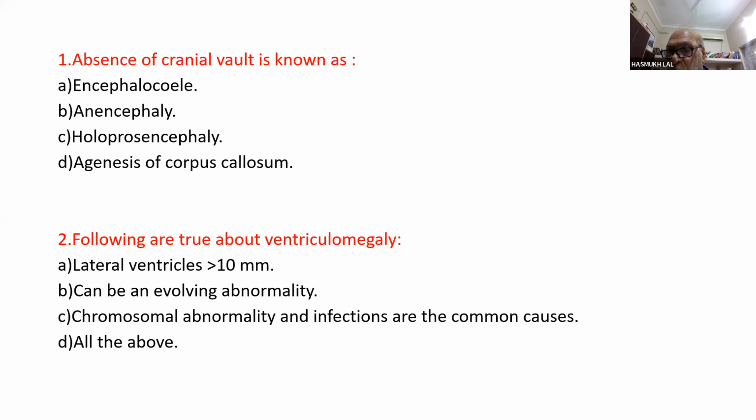the parieto-occipital sulcus and the glomus. So both are actually very, very close. Because the glomus sometimes can be misleading, this parieto-occipital sulcus is the important landmark where we actually measure it. And therefore PPTs will be supplied to all of you, and please go through that over and over again, so that when you actually scan, you will be guided properly.